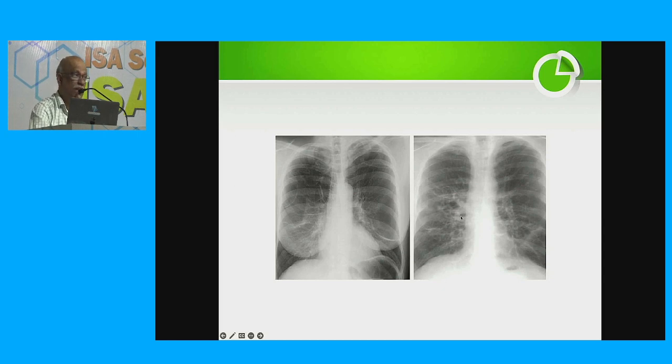What about this second X-ray? Honeycombing can be seen. It looks like bronchiectasis. Yes, bilateral, most likely bronchiectasis. You can see honeycombing-like bilateral bronchiectasis. This patient can come, or this may be the picture of a patient posted for a lobectomy. So the examiner may ask everything about PFT and all those things which we had discussed. So these are in lung fields. These sorts of things you may come across.